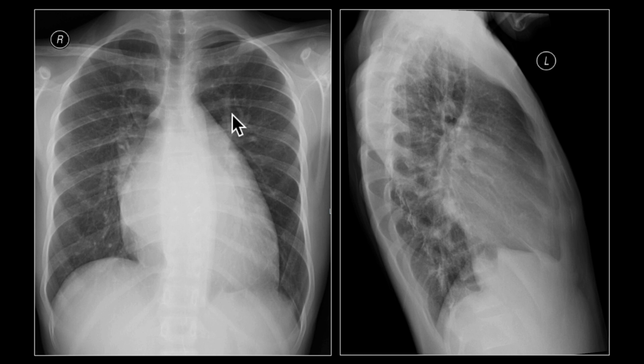Once you see that, try to comment in an oral exam about the other stages of pulmonary edema, which are specifically the interstitial pulmonary edema starting with the Kerley B lines and other lines within the lungs. And if it proceeds to a more severe form, you'll have airspace disease, whether ground glass or consolidation, typically either in a central location, known as a bat wing, or maybe more diffuse with lower lung predominance. So in this case, you do have pulmonary edema in the form of pulmonary venous congestion.